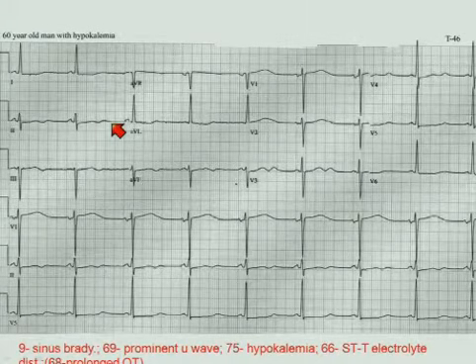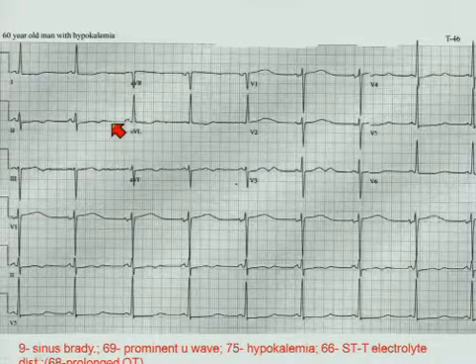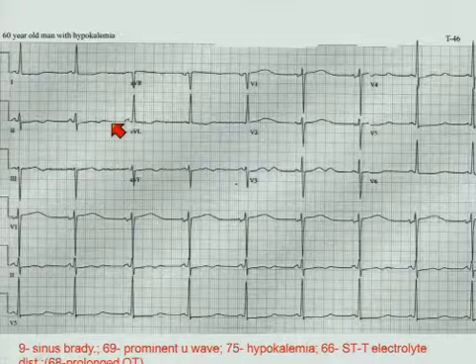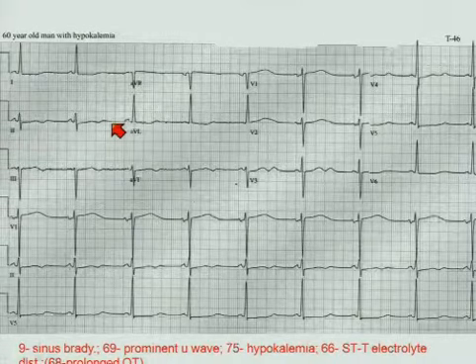In the heart station, you would probably say prolonged QT-U interval. You don't have that option on the test. So if there's any question, you could put both, but clearly you should put prominent U wave here, and relative to the T, this is very suggestive of hypokalemia.